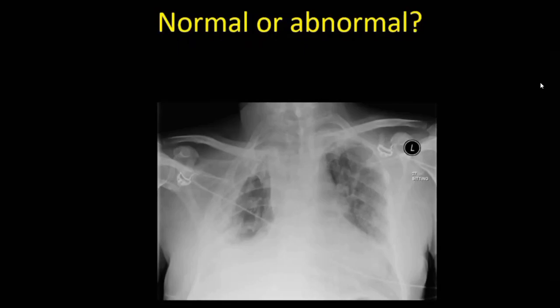But if you have a pneumonectomy, where do you expect the mediastinum to go? So this is the mediastinum. Where do you expect it to move? To stay in its position or to move? It will go to the site of the surgery, because there is lesser amount of space now available, more space available because of the lesser amount of lung.